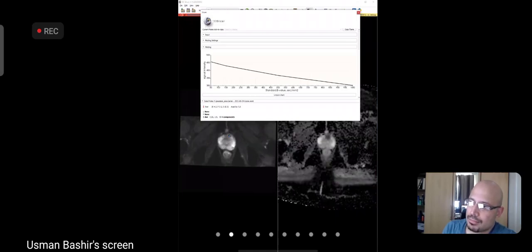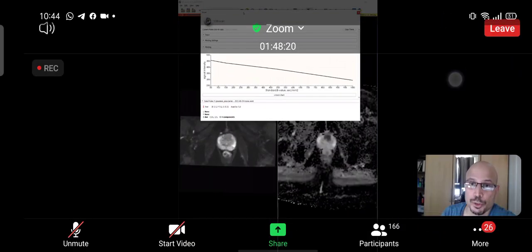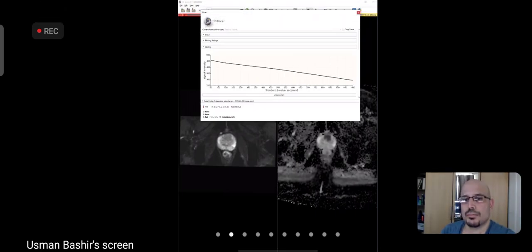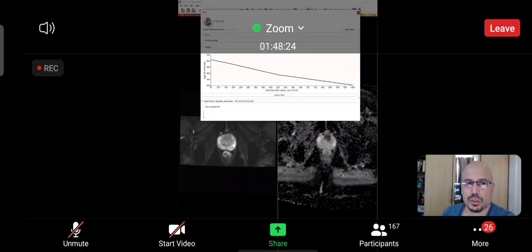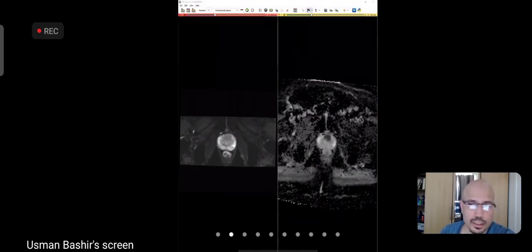Okay, you have to be wary of using just these images, just the DW images, because of something known as T2 shine through effect. ये मैं चाहता हूँ कि आप सब जाके पढ़ें T2 shine through effect if you don't already know about it. Which आज मैं सिर्फ इतना कहूँगा कि अगर आपके पास ये region है, आप नजर रखें इस region पे, ये bright है. So you start with a dark lesion.